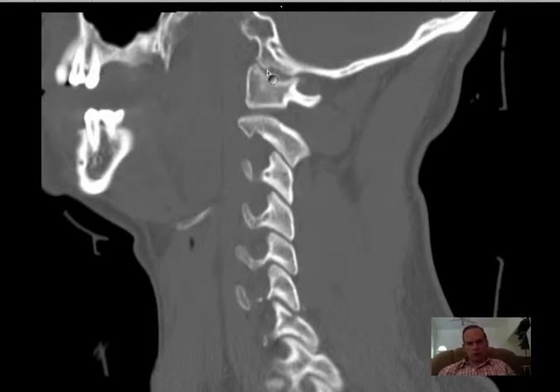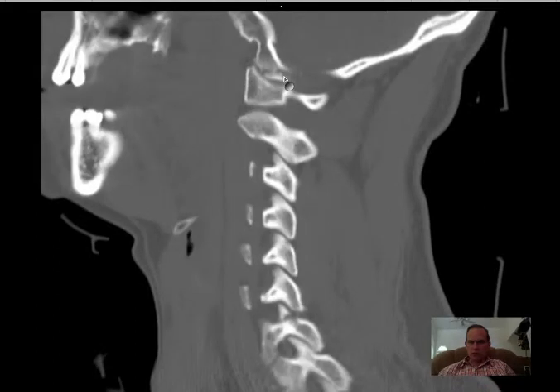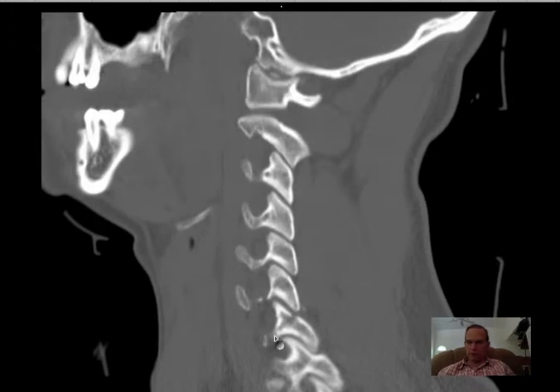Had axial loading, and most of the pressure went down on the left side, fractured this articulation at the junction of the occipital condyle and C1, with relatively minor components of fracture at C1 and at the occipital condyle, but in that same path, in that same weight-bearing cylinder, if you will, there is a fracture of C7, and this is a fracture of the pars interarticularis.